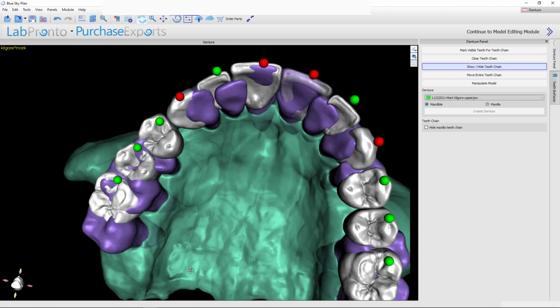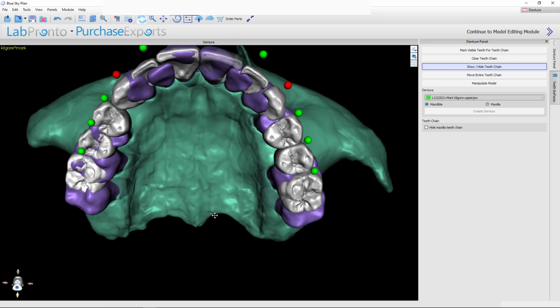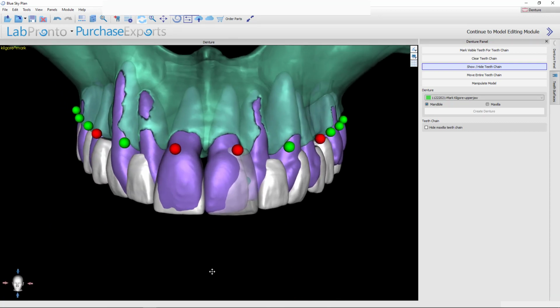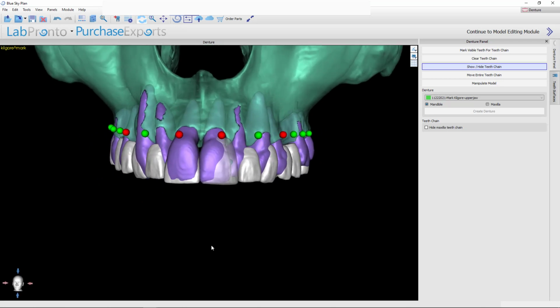All right, so I've actually created just a bit more than what he currently has on that side. I'm going to do it over here. But that's actually a great tip I picked up from Danny Doming. He started showing me some cases of where he's been doing implant rehabs and really assessing intercanine and intermolar widths.